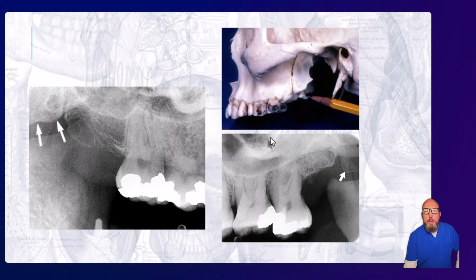All right, this one may be tough to conceptualize unless you're familiar with anatomy, so look at your skulls. But posterior to the maxilla here, the maxillary tuberosity, you have the pterygoid plates, as we see in this skull image here. The lateral plate's larger and is more visible. Sometimes you also see the hamulus that extends down from the medial plate. It's that little hook-shaped projection off the medial plate. Rare to see it clearly, but in this image you can see it really well.